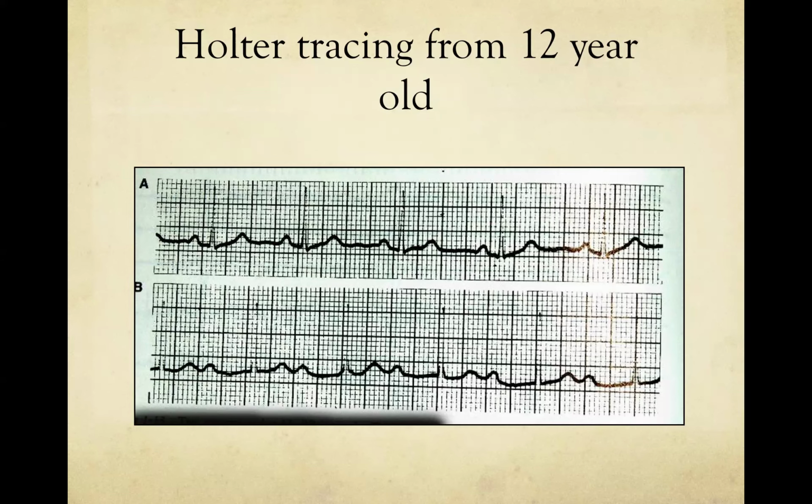If you were on call in the ICU and you saw this, you probably would do nothing about this, but it's an interesting observation. Certainly you'd want to note it in terms of what's going on in the future. Now, the one proviso: if you see dual AV node physiology, you wouldn't just do an ablation for AVNRT. The one proviso is in somebody who has SVT.